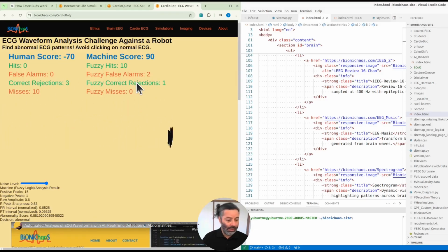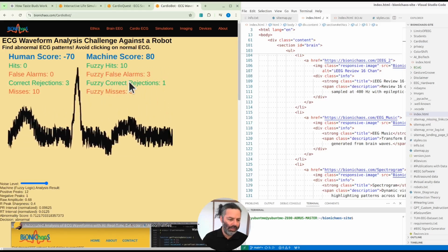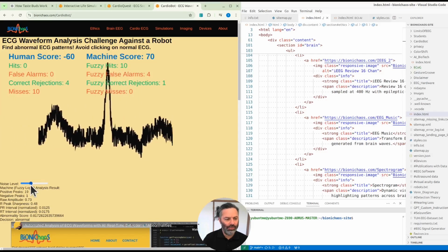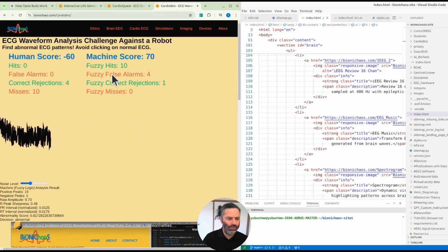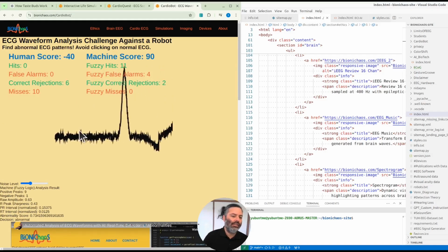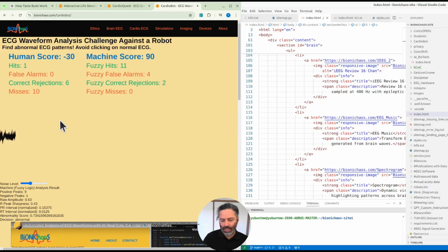speech to text, the transcriber, even Google ones that are meant to be really good, is stuffing the text up. Yeah, if you reduce the noise, then those false alarms should go away. It's actually that slow at the moment because the human score is -50, so it's giving a human a better chance to actually start performing again.